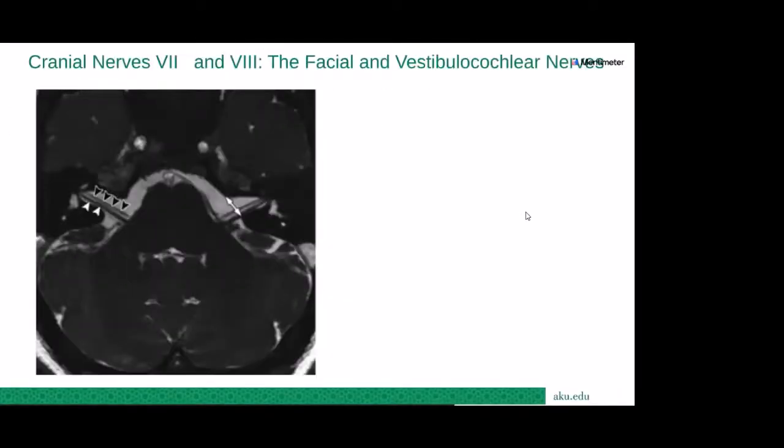So when we are talking about the 7th and 8th cranial nerves, again I'm not talking about where they originate and how they look, where their nuclei are. I am just telling you about the radiological anatomy. For the 7th and 8th cranial nerve anatomical imaging, they run into the cerebellopontine angle, and then they enter into the internal acoustic canal.